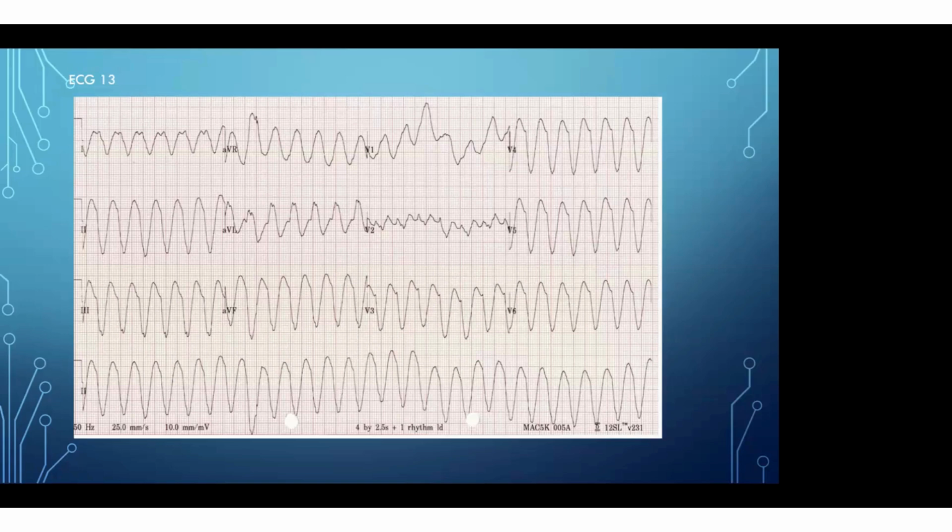So ventricular tachycardia is a regular broad complex tachycardia with features of AV dissociation, and the other features I told you: negative concordance or positive concordance in V1 to V6, positive aVR, and axis shift. One more thing you can see is the initial R to S duration, because this VT is activated through the ventricular myocardium, not through the conduction system.